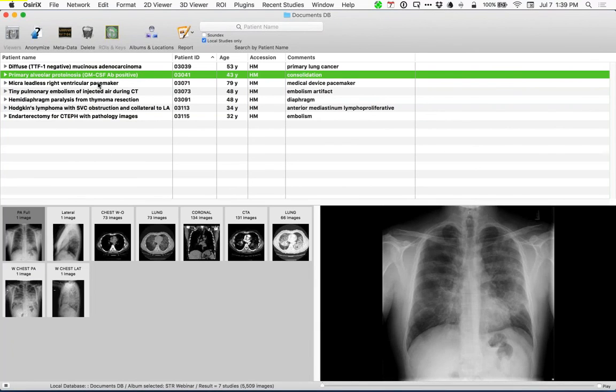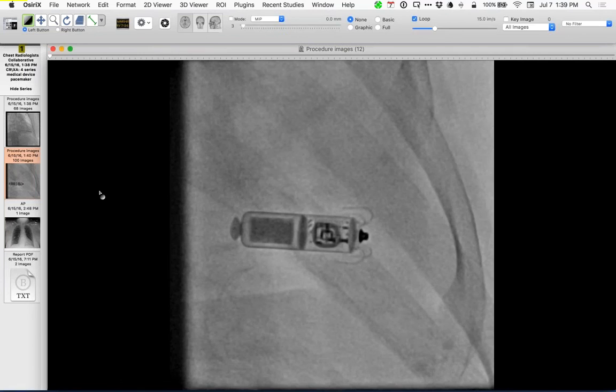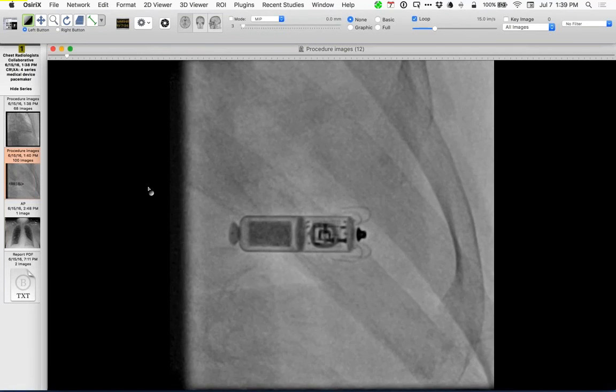All right, this other pacemaker one I'm going to show at a later time because I have another nice example of the one that you showed a couple of weeks ago, David. They're starting to do them here, so I have one or two examples of my own. I can show one bigger picture of it, show the tines right there.